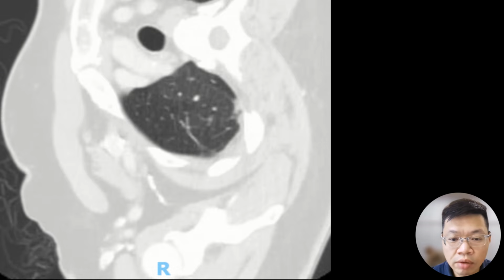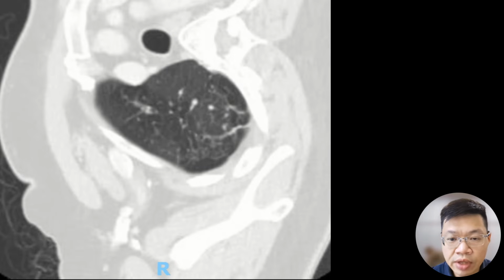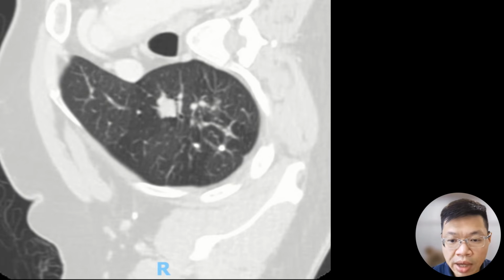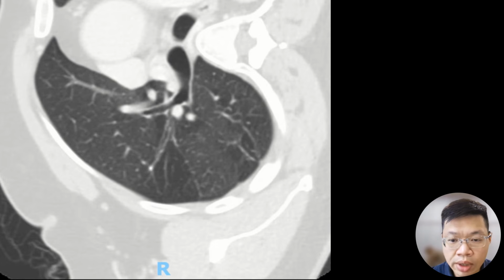It is usually helpful to play through the CT once to be able to determine if there's an airway which leads to the nodule of interest. As I scroll forward and back, you can see that there's an airway which is entering the nodule. We can now proceed to draw an airway map. Please feel free to grab a piece of paper and draw along with me.